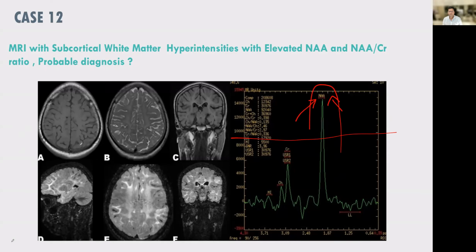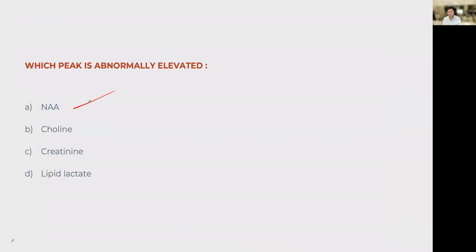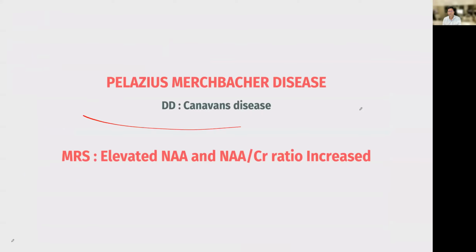And if you see, this is actually not a Canavan per se. Subcortical U fibers are involved. This is actually a double inversion recovery imaging, where you are seeing the subcortical abnormal white matter highlighted. Normally, good white matter will be suppressed. So abnormal white matter will be seen in double inversion recovery much better than in normal sequences. Especially subcortical U fibers are involved. So this is a case of Pelizaeus-Merzbacher disease, and all the people who said it is not Canavan are not wrong.